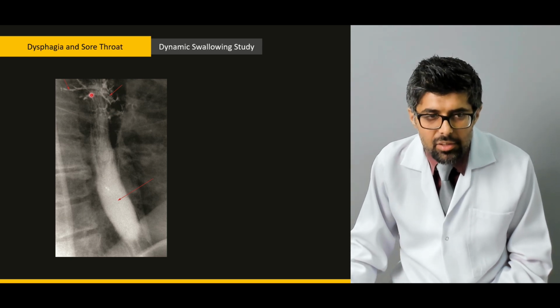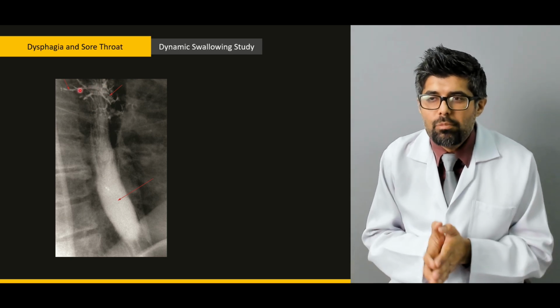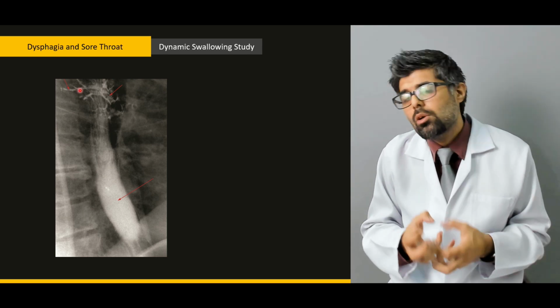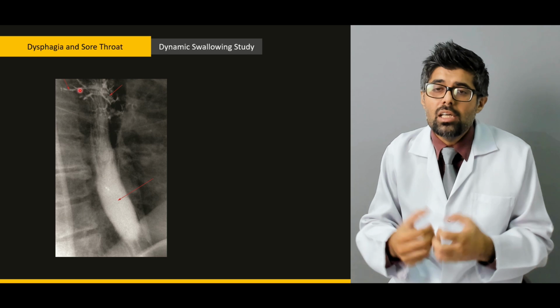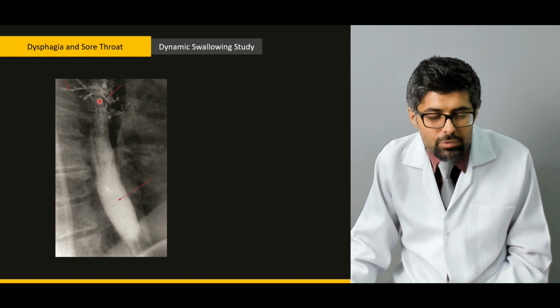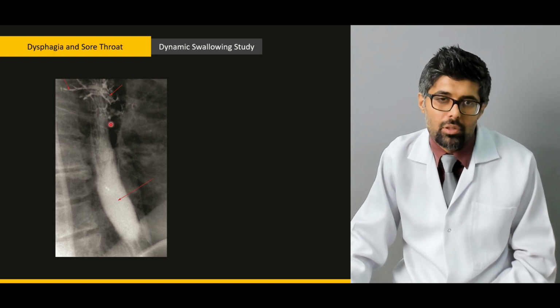Now, these little fibrillar areas are of particular importance. This happens when there is some kind of neurogenic problem in the patient where the epiglottis does not function properly, and the barium splashes around and is aspirated into the lungs. So when that happens, we get a picture not of something this smooth, but like this, irregular and fibrillar.